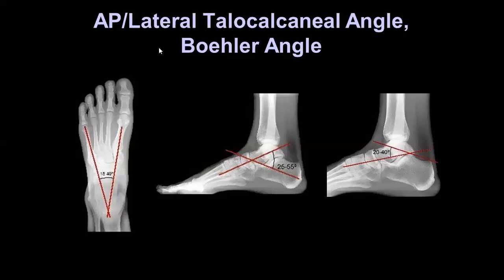So let's go to another aspect, which is the lateral talocalcaneal angle and the Bohler angle. Yes. So what is it? What is the importance of Bohler angle?